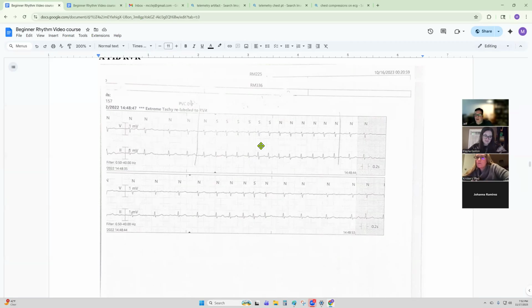But with MAT, again, sudden onset of narrow QRS tachycardia, but there's going to be 3 or more different P waves. Each little P wave has its own inherent heart rate, even though it might normally be between 60 and 100. One might be 111, one might be 137, whatever. So with each inherent heart rate, you're going to see a heart rate fluctuation. So there's going to be irregularity to that R to R. So MAT can look very similar to AFib.